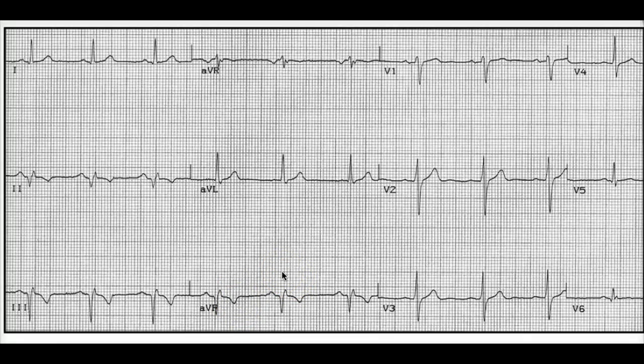In this particular video, I'm only talking about how we can recognize a Q wave. In the subsequent videos, I'll be talking about, okay, when we see a certain Q wave in a certain lead, we have to determine where exactly the infarct is in the heart. But let's take one step at a time. In this video, we can see that the Q waves are building up in 2, more in 3, and we can also see that in AVF.